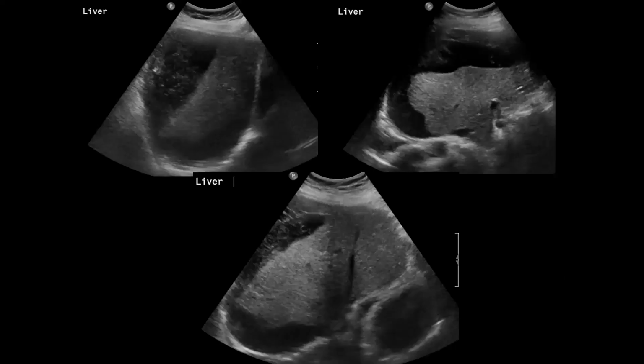Let's go through this one. So yeah, this was a patient that had recent cesarean section and with history of eclampsia. After cesarean section, she had right upper quadrant pain. We did an ultrasound. We saw this large perihepatic collection. You can see this is the outline of the liver, and there's this collection around the liver compressing it. This was actually subcapsular because it had mass effect on the liver. So it's a subcapsular hepatic collection.